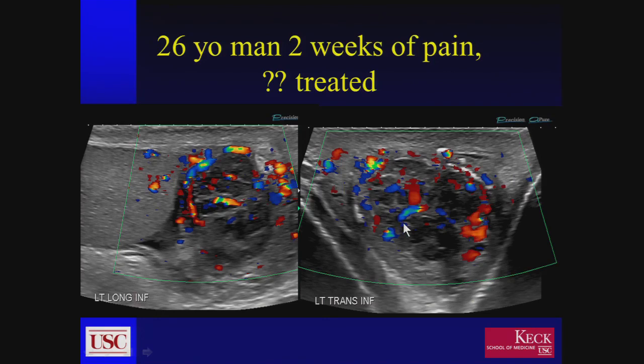Do remember that when you scan for epididymoorchitis, about 30% of epididymitis will actually be focal, and the most common place for focal epididymitis is in the tail. And remember, the tail is relatively mobile, so make sure that you or your techs, when they scan for these kinds of situations, always look below the testicle to see if they can find this enlarged hypervascular epididymal tail. It's a very common place for focal epididymitis to occur.